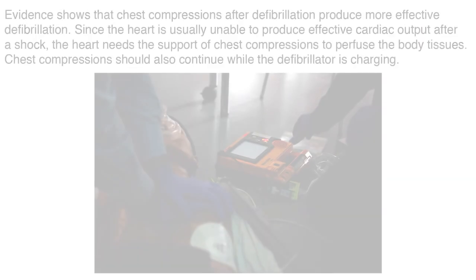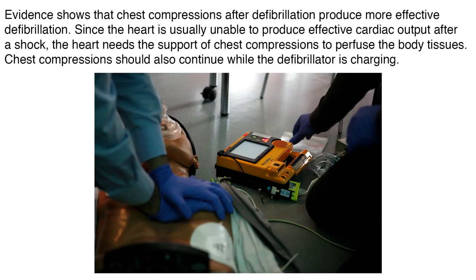It is recommended to give a single shock immediately followed by 2 minutes of CPR. Evidence shows that chest compressions after defibrillation produce more effective defibrillation. Since the heart is usually unable to produce effective cardiac output after a shock, the heart needs the support of chest compressions to perfuse the body tissues. Chest compressions should also continue while the defibrillator is charging.